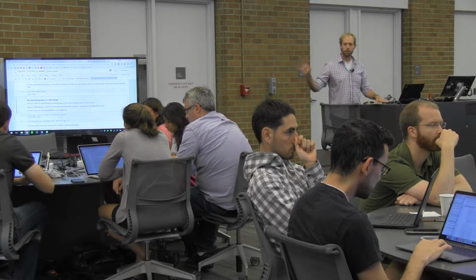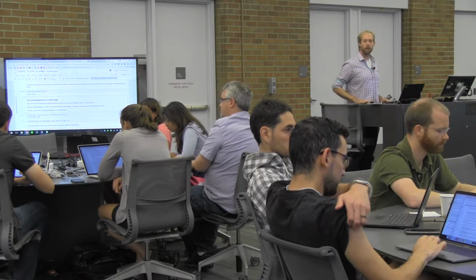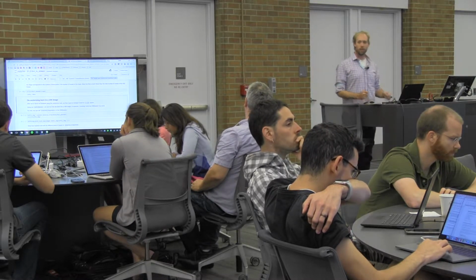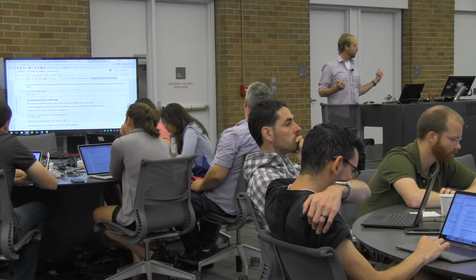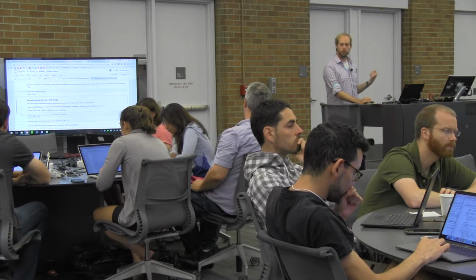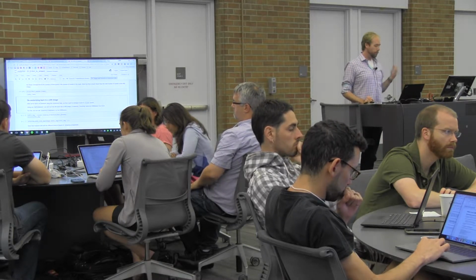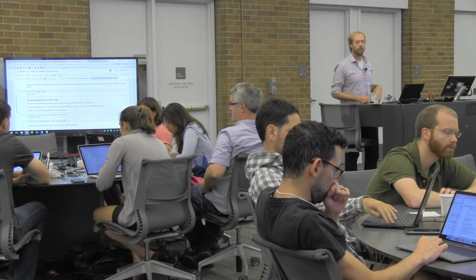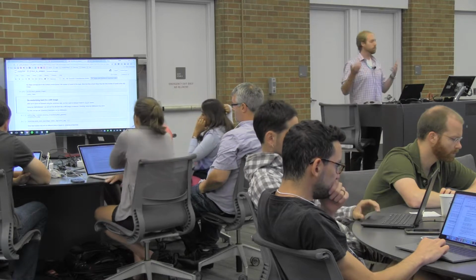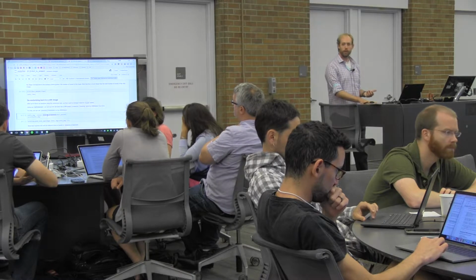So we're going to go into the actual model fitting and stuff in the next notebook. But the one thing that I wanted to note that's particularly useful for these sort of Nifty Masker style objects is that they can also move in the opposite direction as well. So once we've gone from a 4D array into a 2D samples by features array, we often then want to move back into 4D space. Here I'm just going to do it on the same data, but usually you would do this on, for example, a statistical map that you would fit using some sort of Scikit-Learn object. And to do that, you use this inverse_transform function.